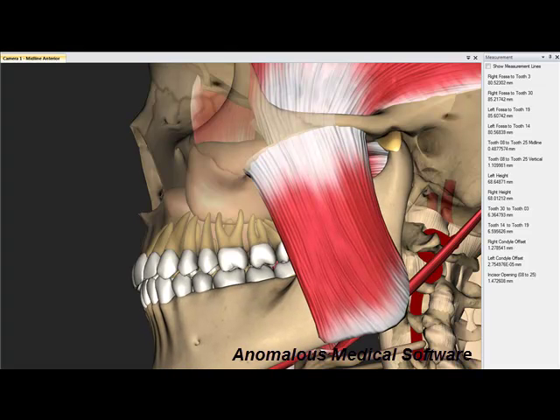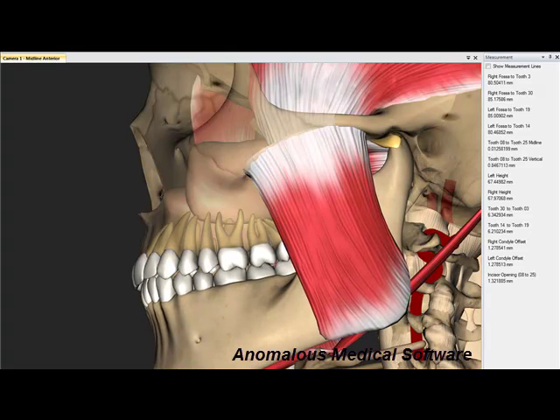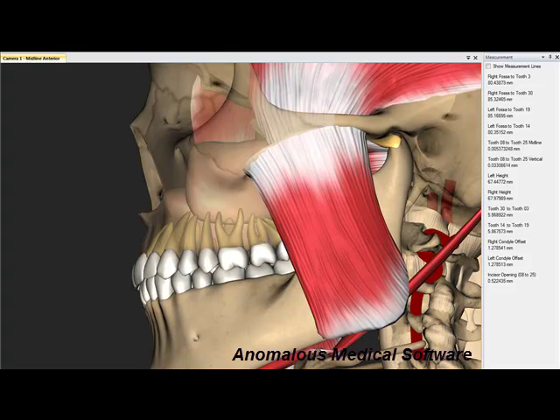However, with distortion of the left temporomandibular joint disc, that number drops down to 84.79 millimeters. And then with more adaptation of the teeth, which I'm doing right now, the number is going back up to about 85.